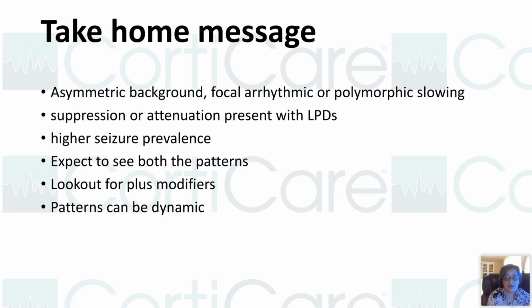Sometimes it's hard to say if it is LRDA plus S or LPDs plus R. So that's when you rely on the terminology. Look out for plus modifiers. If you see a modifier, the prevalence of seizures is high. The seizure risk is high in those patients. These patterns can be dynamic. Like I said, they can be interchangeable too.